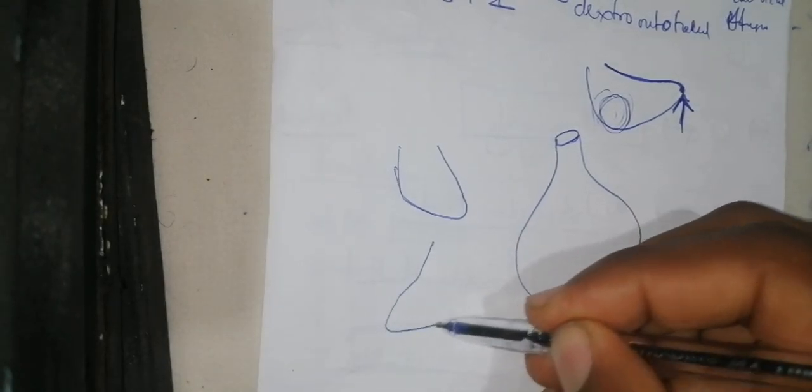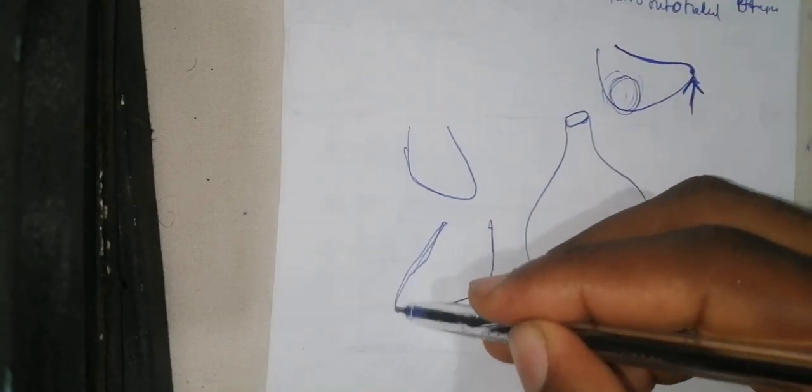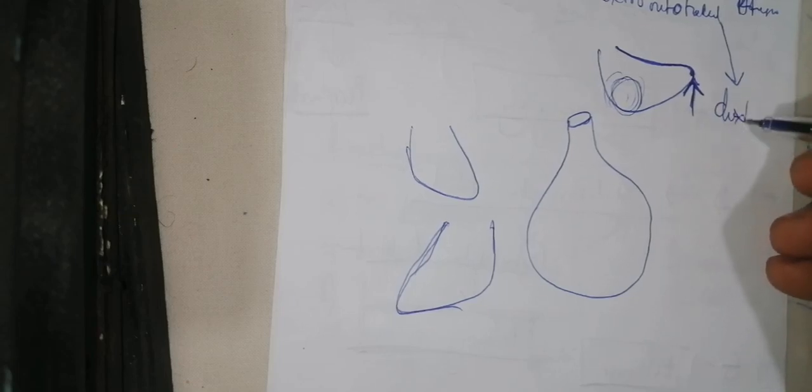Normally the heart should be like this. Is it clear? But if you see instead the heart like this on your chest X-ray, in the normal view, you now see that this is a dextro-rotated heart, and this occurs in dextrocardia.